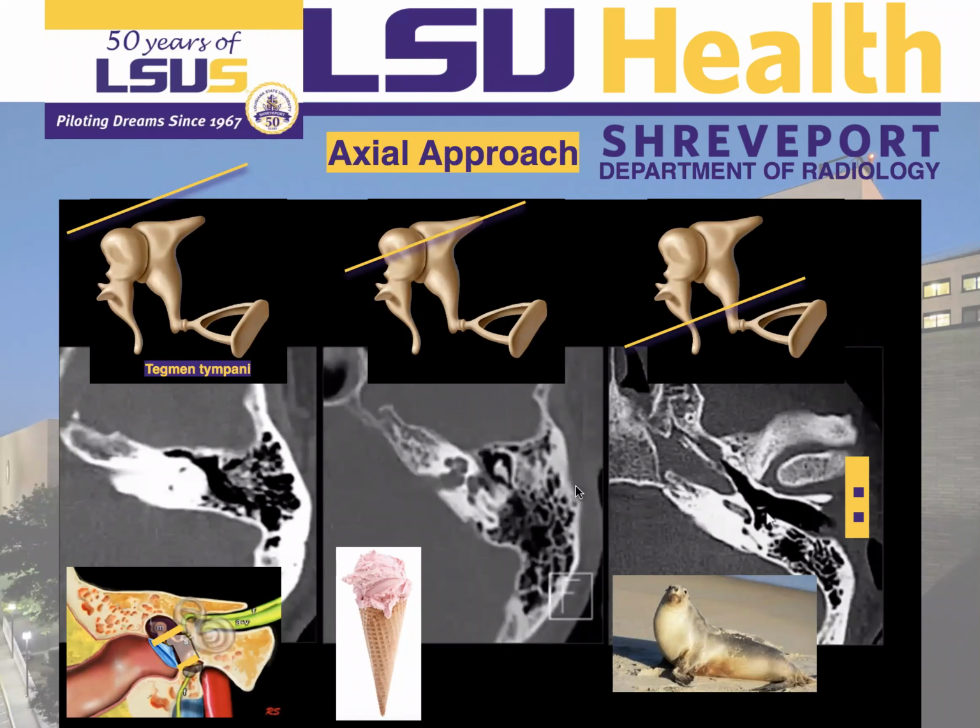Now, let's talk about what really matters for us, reading a CT. Okay? We're gonna be guided by the ossicles and by the middle ear. Okay, we're gonna read the epitympanum, the mesotympanum, and the hypotympanum. So when we are in an upper slice here, we don't see the ossicles, we just see air and the tegmen tympani. We're at this level here, the epitympanum.